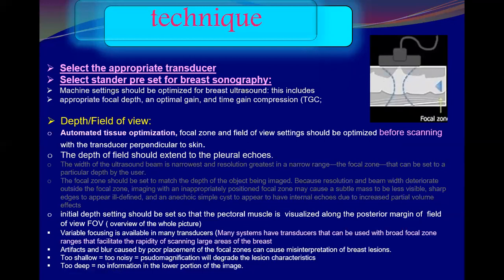And the elevation plane usually works at a fixed number for each machine, but in the new machines they also optimize it. We'll talk about the elevation plane later, inshallah.